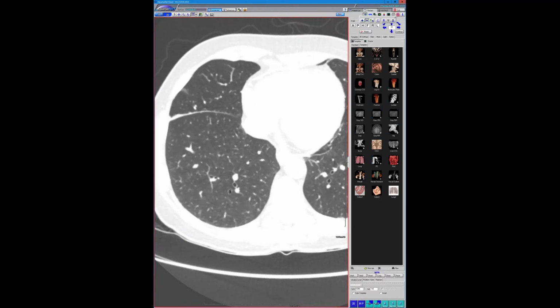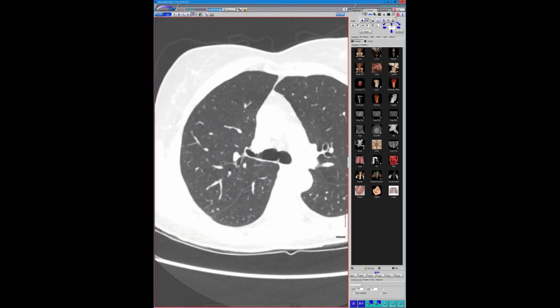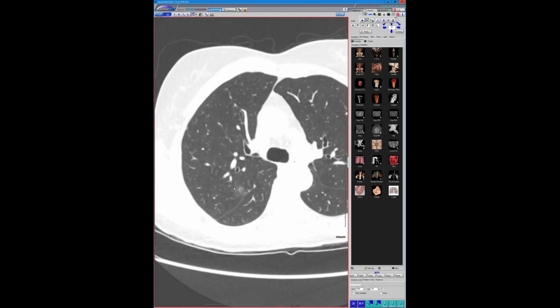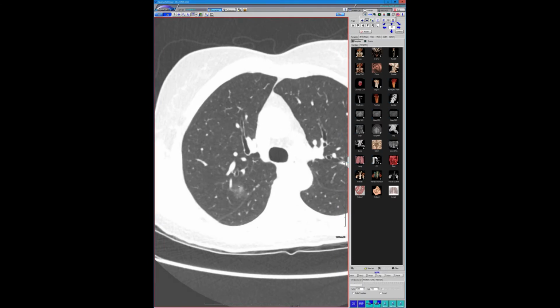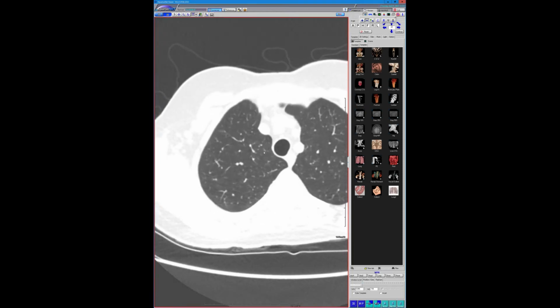We'll have that little Cheerio sign, but she also had this nodule, ground glass, mixed solid ground glass, subsolid, whatever you want to call it. That's mostly subsolid. I guess there's really not a solid component, but that was taken out.